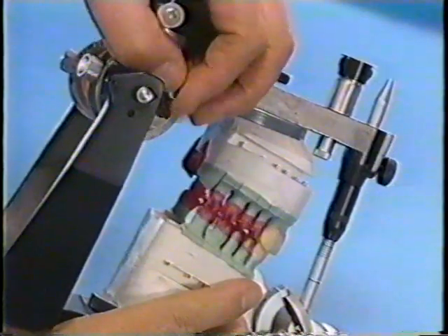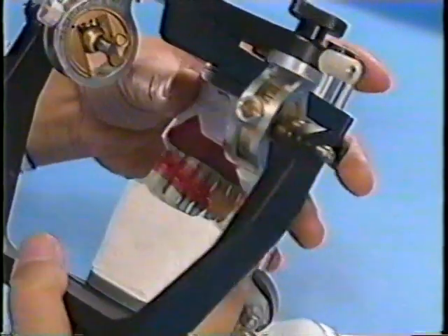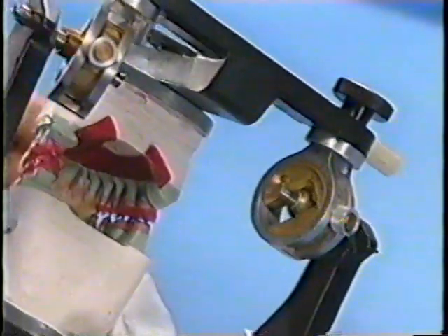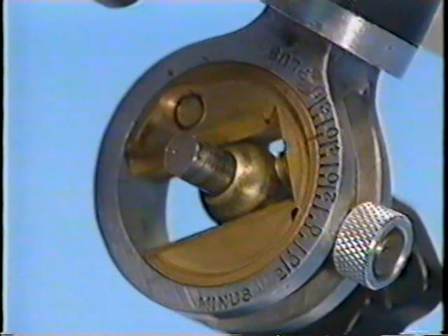Once we've inserted wax rods into the maxilla and mandible, we can confirm that the antagonistic rods are optimally fitted by checking for lateral movement. Ideally, the maxillary and mandibular wax rods should fit within the intervals between their antagonists, exhibiting no cuspal interference.